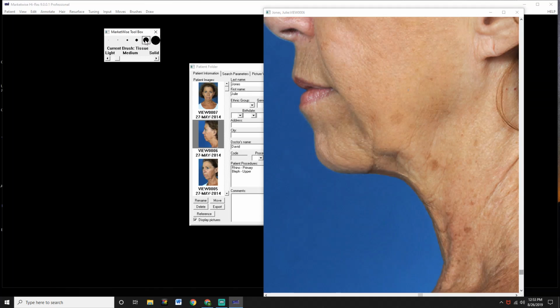Now I'm going to grab a bigger size tool and I'm going to turn my intensity down even more, almost underneath the T of light. And so now I'm going to go back over to my picture with my little tool. I'm going to click down in this dark area, and it's coming in lighter now, and I'm kind of sketching with this. I'm dragging the tool along that dark edge and I'm softening it. Now, this is just the very beginning of this, but already you can see that it looks better.